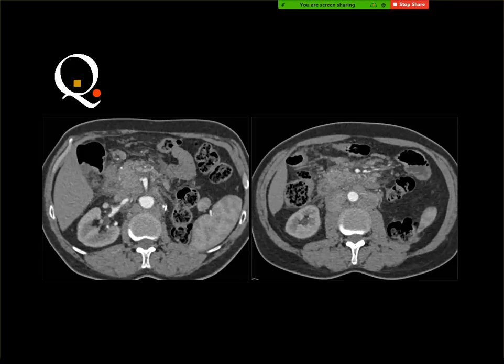Left kidney is missing, and this is high for retroperitoneal fibrosis. Lymphoma, I think lymphoma, of the nodes. What about the kidney? Maybe it was removed, nephrectomy. Yes, and this is what I want to say. You see these surgical stitches here, and this kidney is removed.